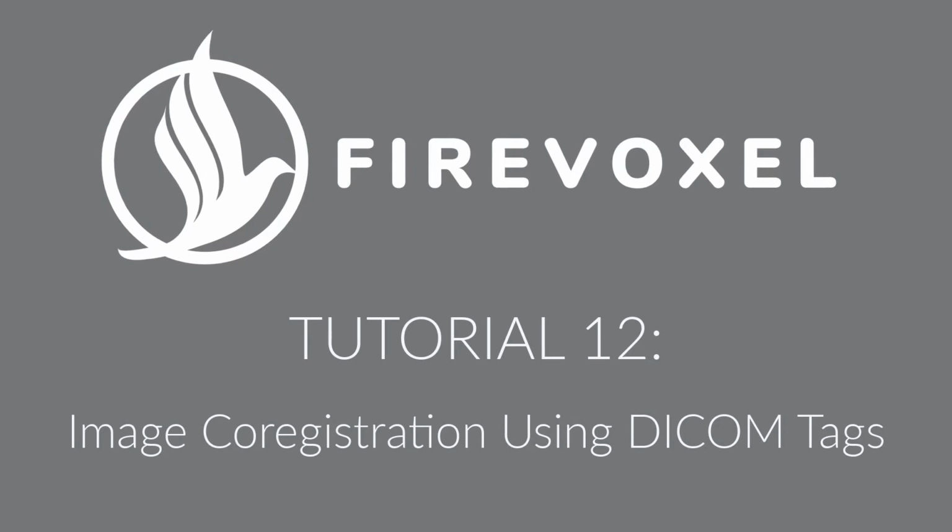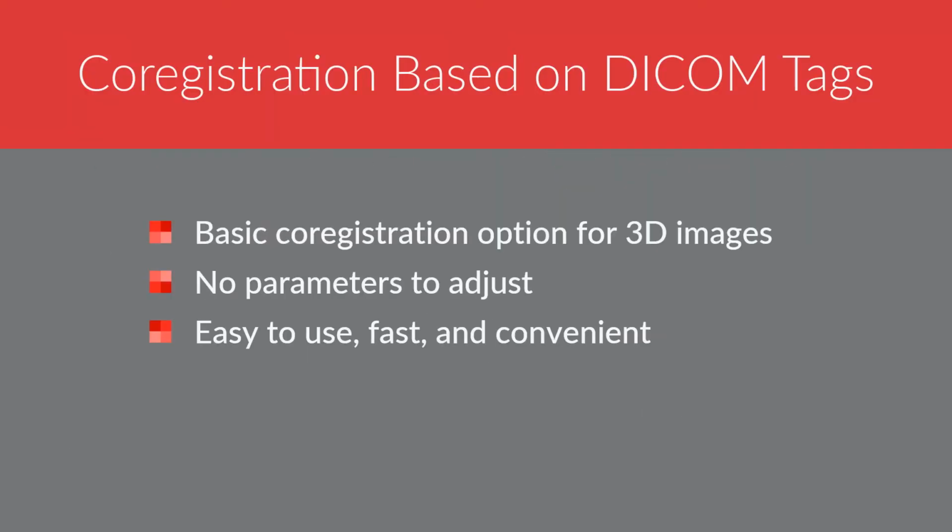This tutorial presents the most attractive method to co-register two three-dimensional images. This method is fast and requires no parameters to be adjusted, and therefore it is often the method of choice for co-registering images acquired during the same exam.